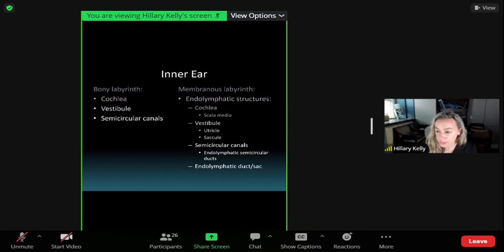It can also result in sound-induced vertigo, something called Tullio's phenomenon. Not important to memorize them, but essentially down the barrel of the superior canal and parallel to the superior canal to look for areas of bony dehiscence up here, which can result in, again, vertigo and conductive hearing loss.